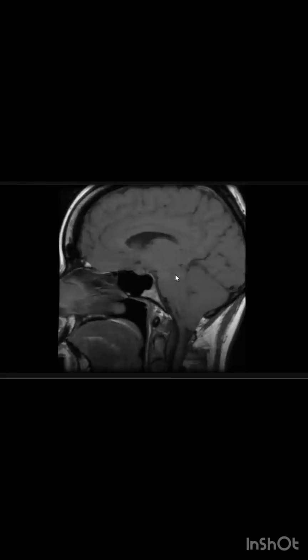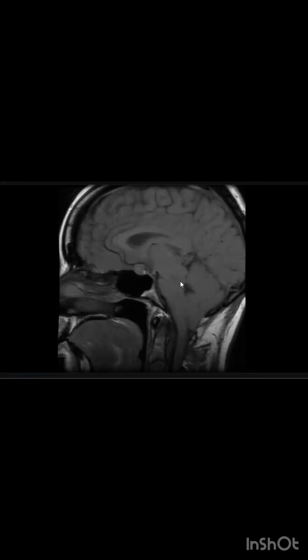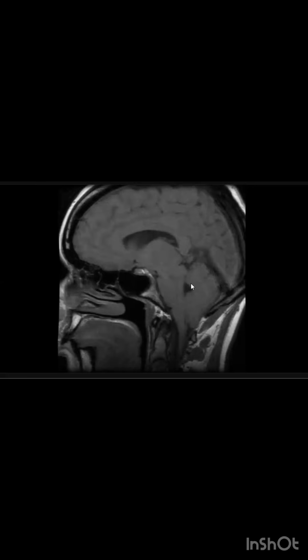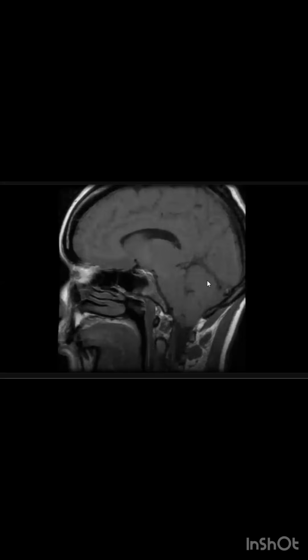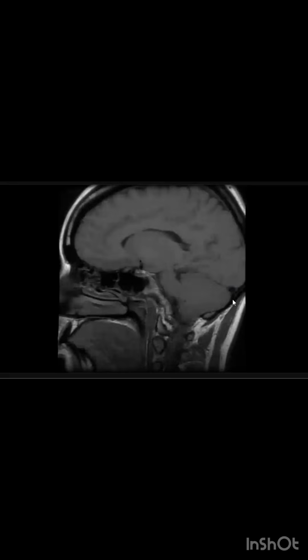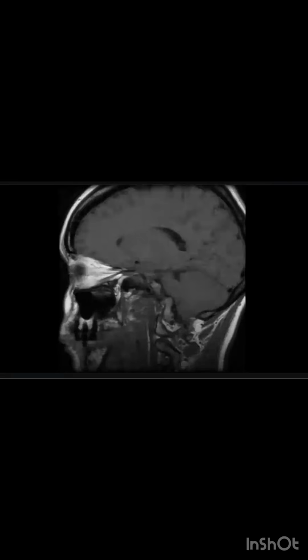This patient has 5 years history of headache, and the pituitary fossa is engorged. I'm looking at the hypotension features, and I can see some sagging of the midbrain as well. The straight sinus looks normal, but definitely I need to see the contrast enhanced images, and MRV to assess the dural sinus.